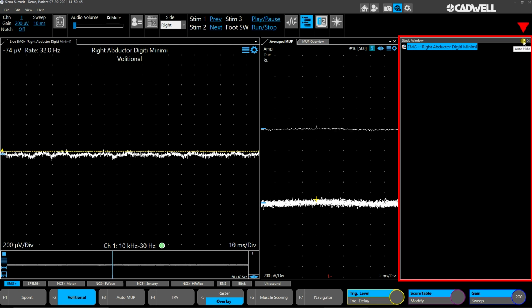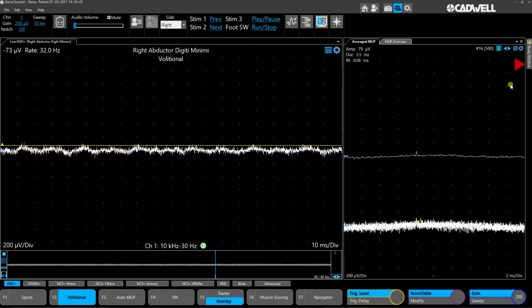If the pin is pointing down, that means it's pinned right there. It's going to stay there. It's just another way to dock a window. However, with this kind of window that's docked to the side of the screen, you can actually unpin it, and now it will auto hide, which basically compacts it to the right side of the screen.